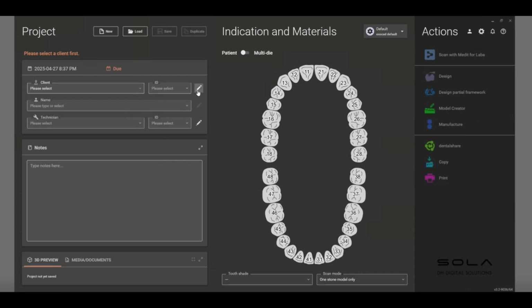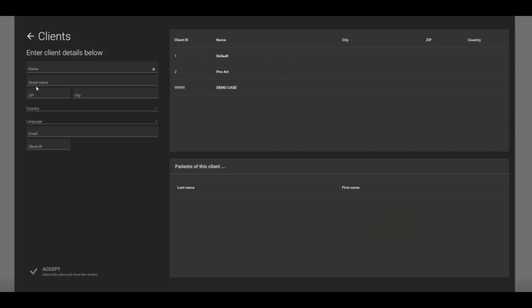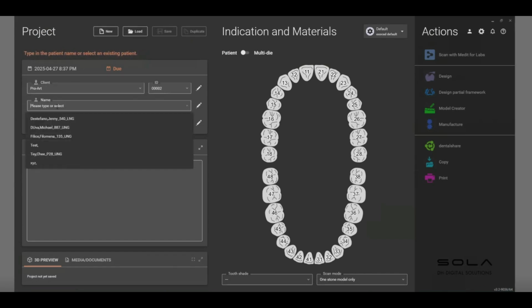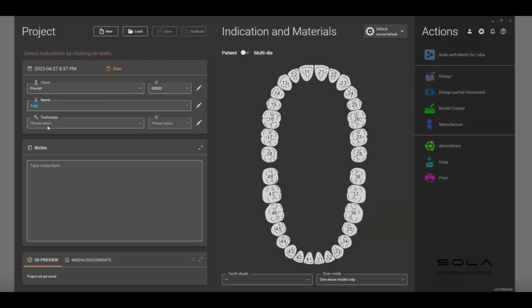You can add a new one. You can add a new ID in here, and you can add a new ID over here onto your computers. I've added this one, so I'll choose this one. And the name of the file can be whatever. It can be anything, XYZ. I'll just call that a test file. And then new, I'll just call that.